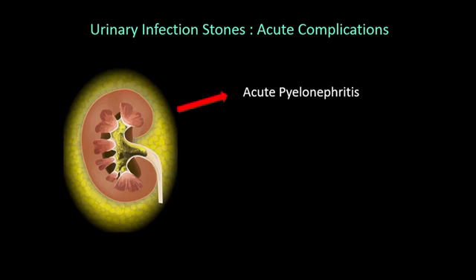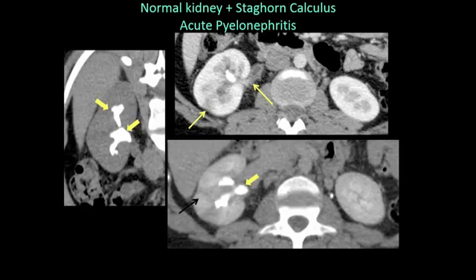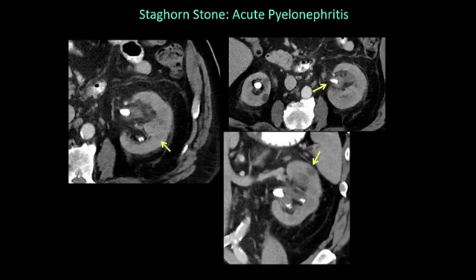They can have pyelonephritis, they can have perirenal abscesses or abscesses to these stones. They can obstruct the collecting system with superimposed pus-filled urine, and you can have urinary sepsis. And you want to think about that when you see staghorn calculus. So here's a patient who has staghorn calculus, but more importantly, you have to say that there is pyelonephritis with the stone. Urothelial enhancement has to be adequately taken care of, otherwise there will be big problems for this patient in the future. Here's another patient who's got a staghorn calculus, but look what's happening.